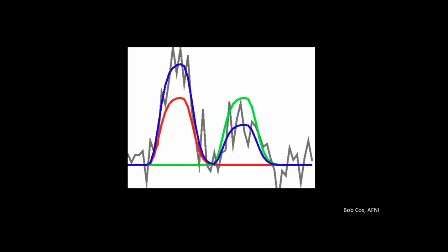So with incongruent versus congruent, for example, we're keeping everything the same. We're just changing whether the flanking arrows are congruent or incongruent, right? So all we're changing is the congruency dimension. Okay, and we just do this at every voxel.